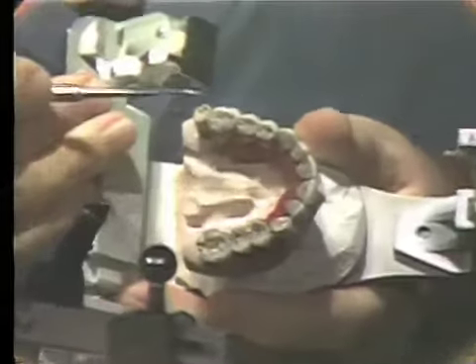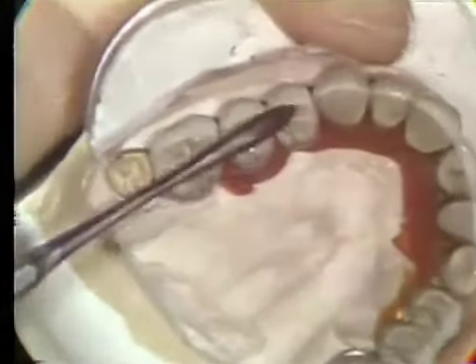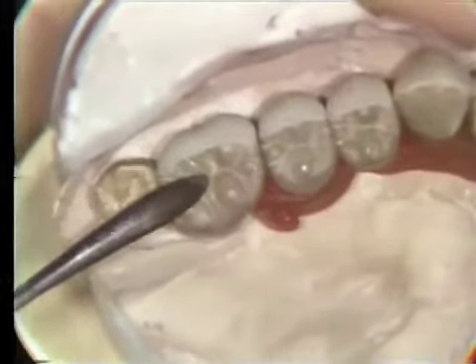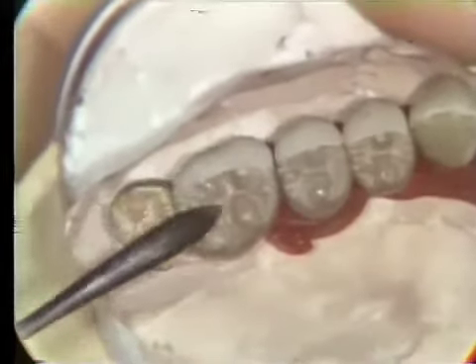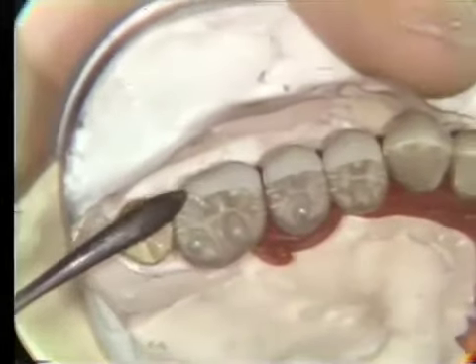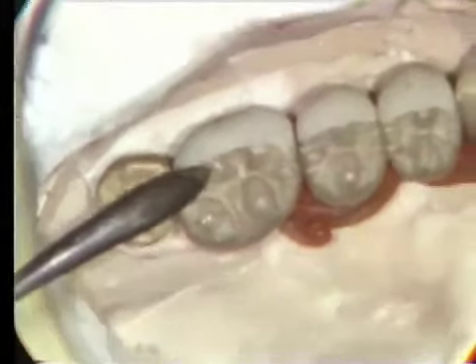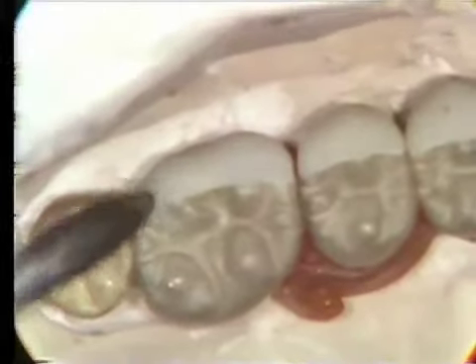As you see here, we have extended the porcelain over the occlusal surface so that we have porcelain cusps contacting. Now we can do this if you do not have any occlusal contact going over this margin. We have waxed the case so that it will function and clear out without contacting these porcelain areas. If you're going to have a cusp go over the porcelain gold margin, then you're going to fracture a facing. But with the proper design of the occlusion, you can carry this porcelain, as you can see, onto these cusp areas so that it will hide the show of gold.